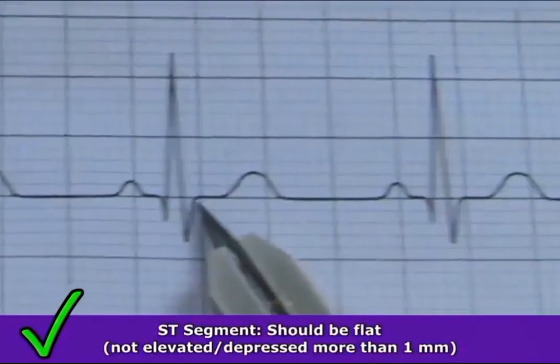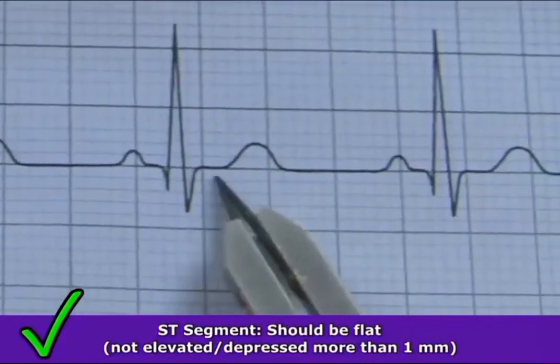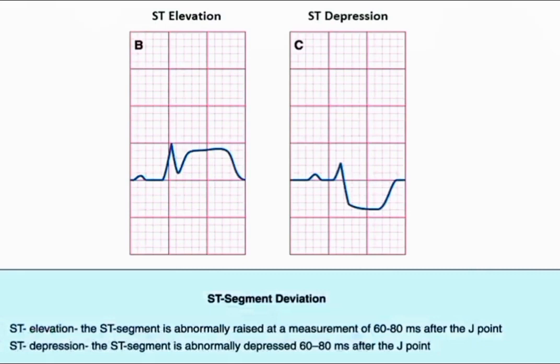Then there's the ST segment. This starts at the end of the S wave and stops at the start of the T wave. It should be flat, shouldn't be elevated or depressed. And if it is, it should be no more than 1 millimeter. And here is an example of an abnormal ST segment. Here we have ST elevation. Here we have ST depression.